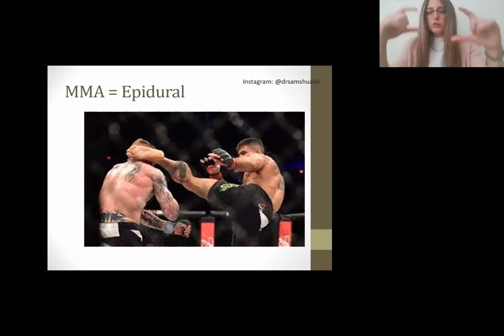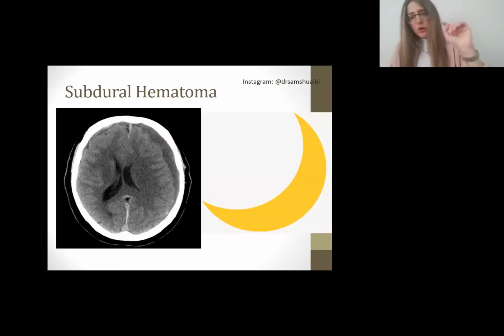This is just an epidural hematoma waiting to happen. MMA right here, epidural, okay? MMA, mixed martial arts, huh? Okay, subdural hematoma. Subdural hematoma looks like a crescent.